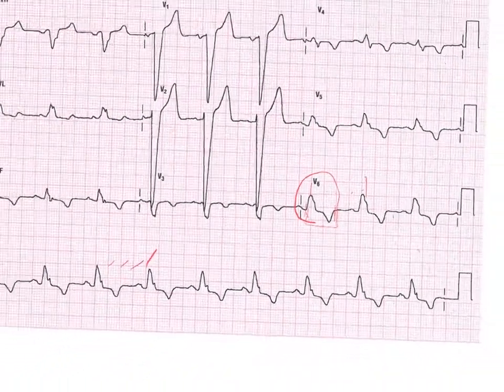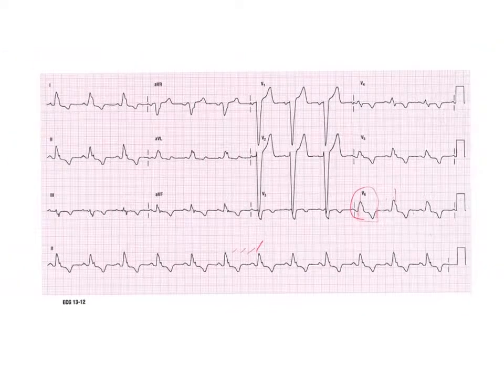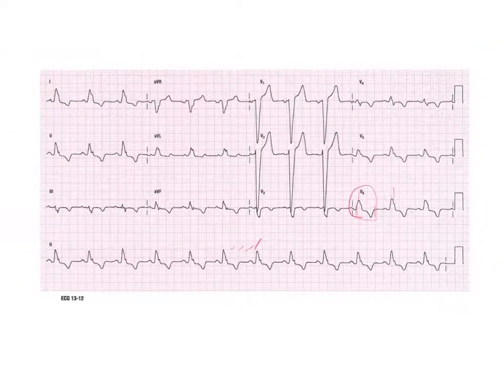So we do have a little bit of a lengthened, prolonged QT interval, which makes us a little bit concerned that this patient might be at risk for some torsades. And so we have rate, P waves, and M pretty well done. Now we're going to do A, B, and C. Axis-wise, we're upright in 1 and AVF, so axis is normal.